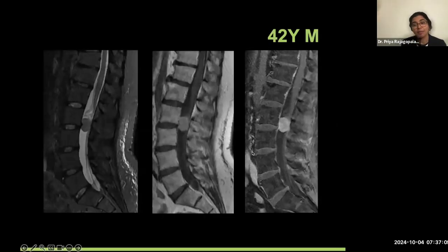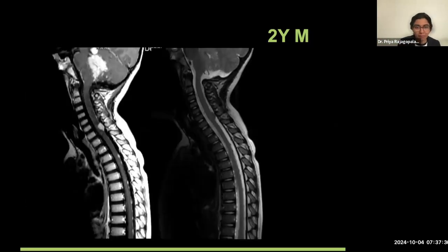Here's another example. Like I said, lumbar is not a very common location. So here was a tumor which is kind of T2 intermediate to darker in appearance, although this is a common location for a myxopapillary ependymoma. But it was more darker and it was more solidly enhancing, unlike that cystic, didn't have any polar cyst, didn't have hemosiderin. So it behaved like one, and it actually ended up being a meningioma as well.